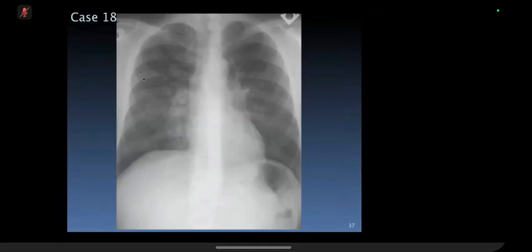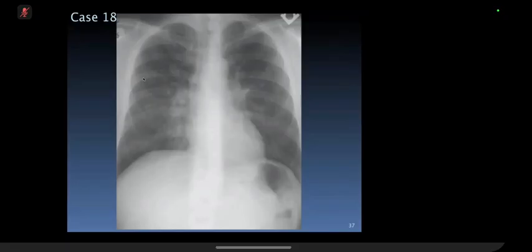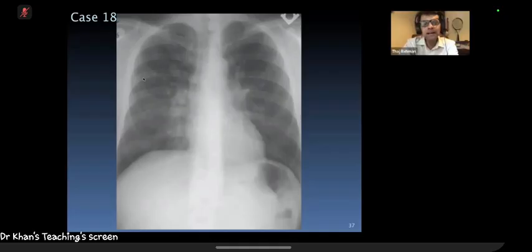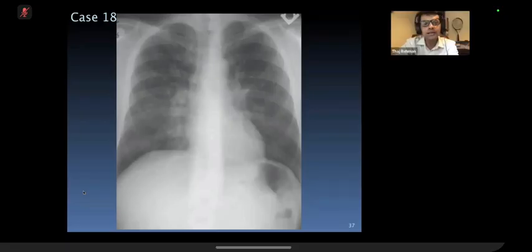Next. This is a frontal chest radiograph of an adult patient. There are bilateral cystic or at least circular densities. Very good. I'm quite pleased with that diagnosis. So this is also, I think, mostly mid and lower zone. I can't see much in the upper zone. So I think this is bronchiectasis as well. Very good. So this is not LAM. This is not LCH. Is there any reason why you say the cystic opacities here are not LAM or LCH?